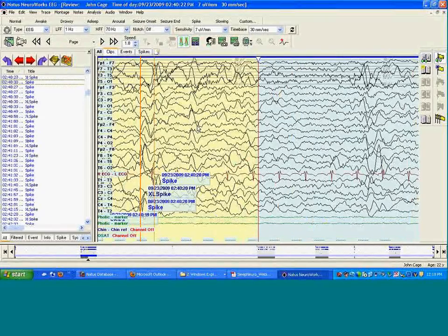All right. Now, if you're not familiar with this tool, you may be familiar with pruning, because you'll take a long-term study, a 72-hour study, and you may create a pruned study of a couple of hours containing your events of interest. If you don't want to go through the pruning process, or the process of actually creating a separate study, you can use the Clips option here.